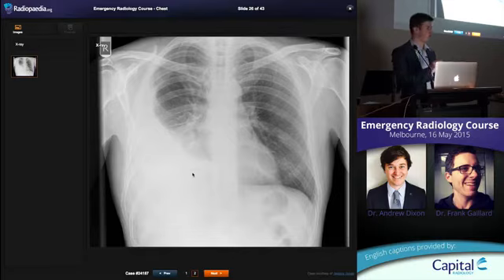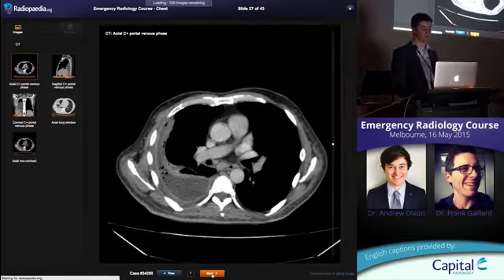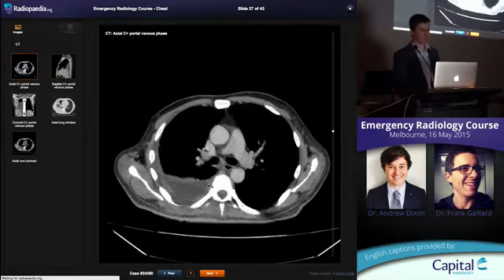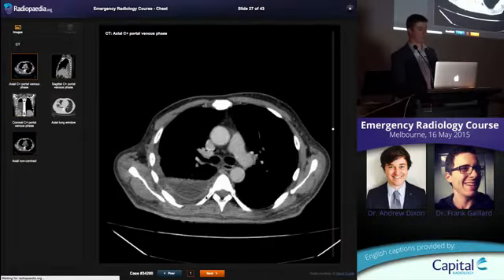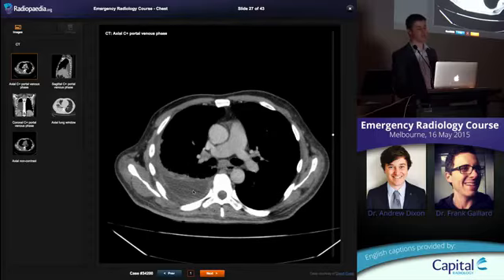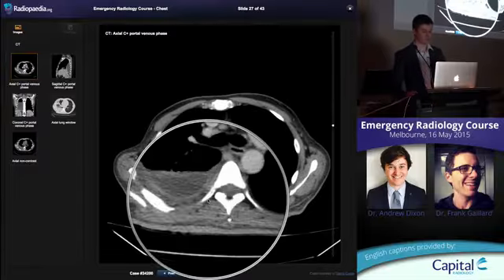So just looking at the contour of it, does it make sense? Is it sitting perfectly the way gravity intends it? Or is it forming some funny contours? Here's a patient with empyema. If we go back to that patient that had pleural effusion, if you looked carefully, you'd see that there's no enhancement of the pleura. You can't see it. It's wafer thin, okay? In the setting of empyema, that pleura gets thickened and enhances, and you can see that really well on the CT here.